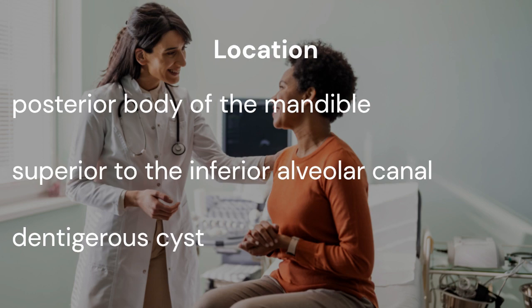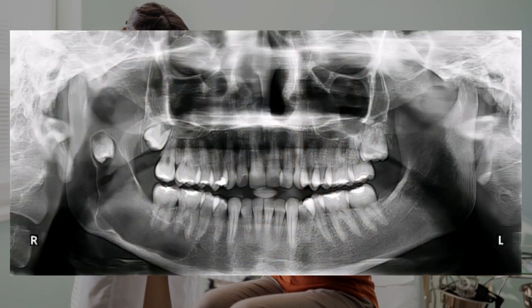In this panoramic image, a large odontogenic keratocyst is associated with the follicle of the displaced mandibular right third molar. Note the change to the contour of the third molar follicle. The contour of the follicle and the change in its size occur coronal to the cement enamel junction of the third molar. OKCs have a well-defined and corticated periphery. The periphery is smooth, but its border may scallop a thick bone cortex.